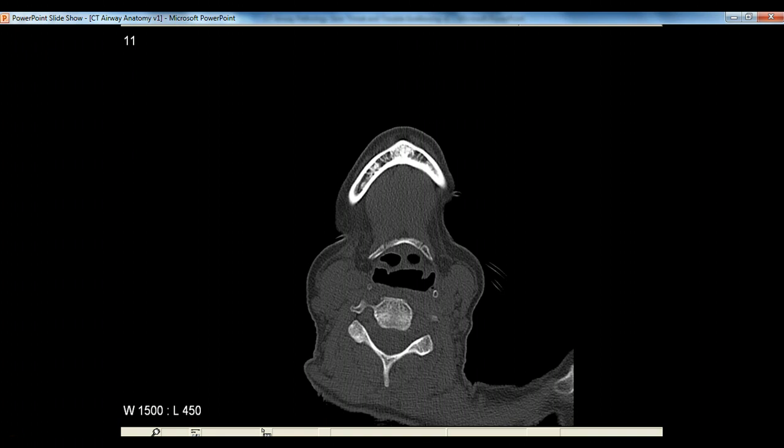The hyoepiglottic ligament attaches it, you can pretty much see that right there, from the hyoid to your epiglottis. It attaches to your jaw, it attaches to your tongue, it attaches down actually almost to the level of your collarbones. It attaches to everything.